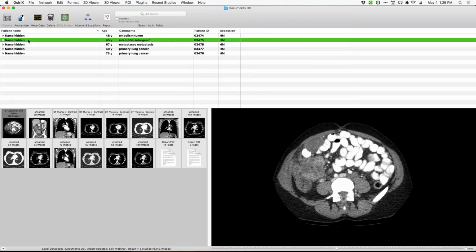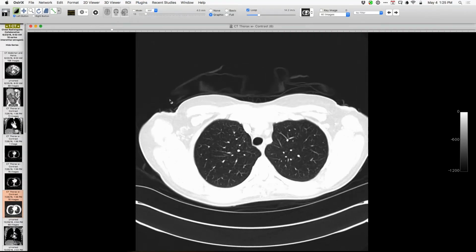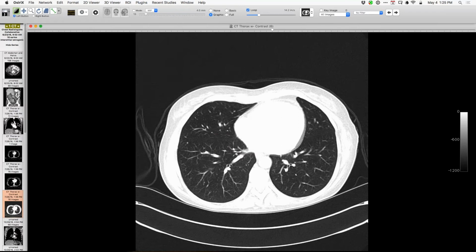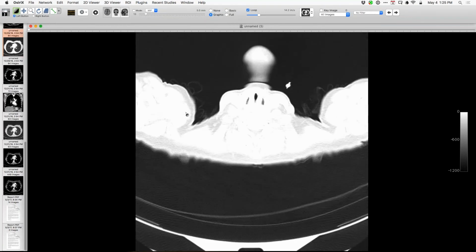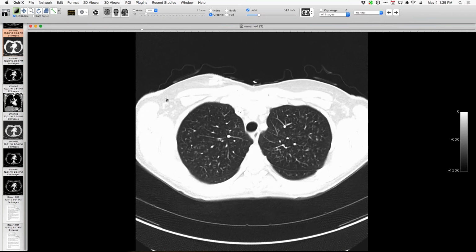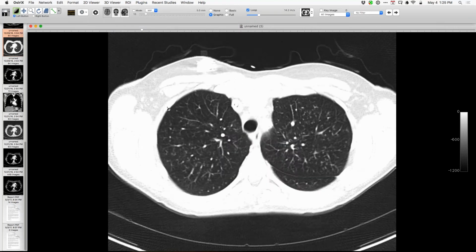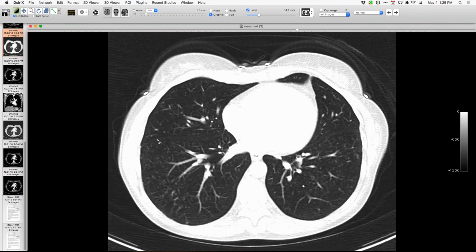All right, let me show you this one. This is an oncology patient. I'm just going to withhold some information for the moment, but this is a CT from last year. And then the CT in follow-up that was particularly interesting started to appear in October. I will show you what the lungs look like, this being October, and give you a feel for these bilateral diffuse centrilobular nodular patterns.